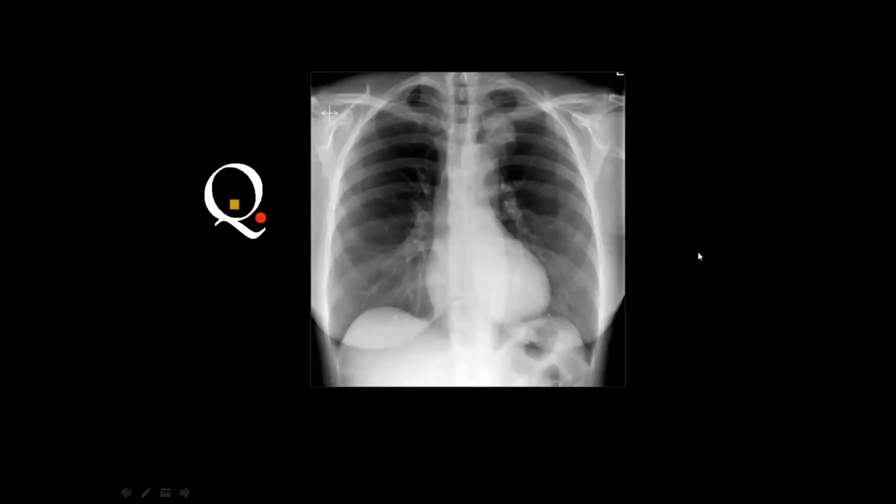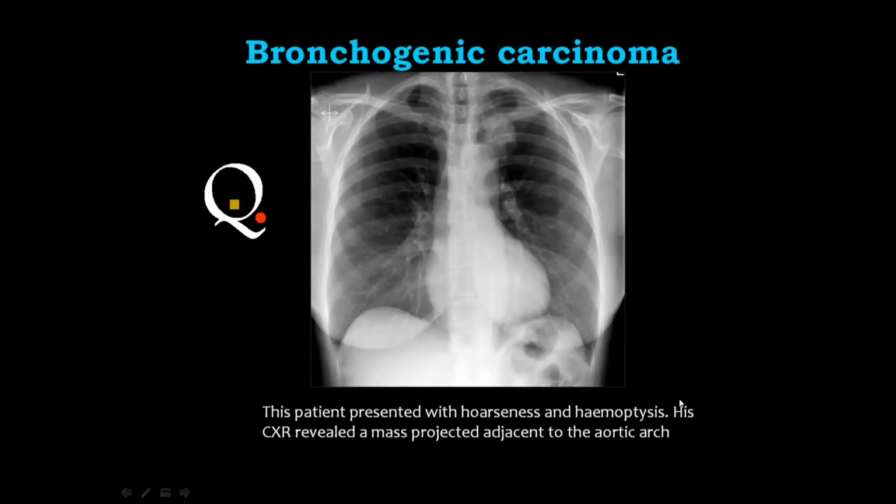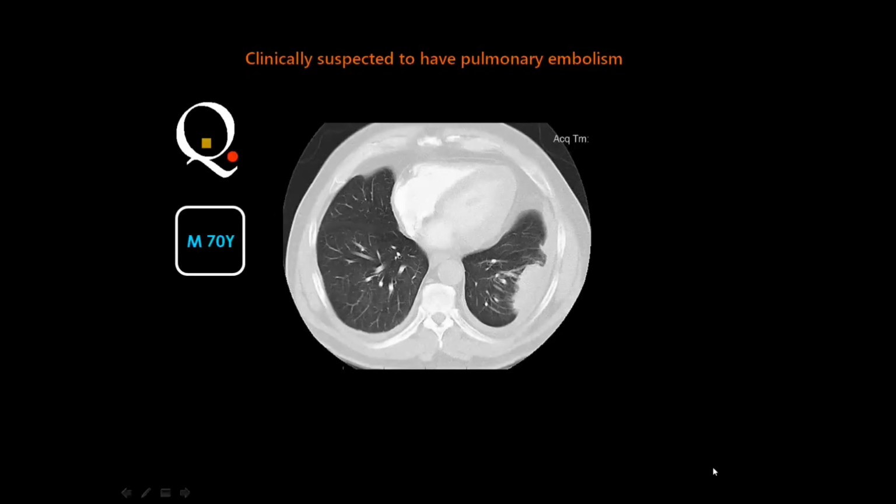No, this is not actually a Pancoast tumor. This is a lesion which is located adjacent to the aortic arch, and it is in the range of a pulmonary mass, and you should consider any pulmonary mass in an adult representing a bronchogenic carcinoma until proved otherwise. And a mass like this is considered from the plain film to represent bronchogenic carcinoma. And you may say Pancoast tumor whenever you see the mass affecting one of the adjacent ribs at the apex of the lung. Next case.